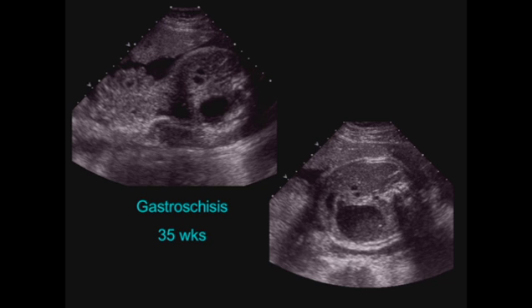Now, of course, this was 9 o'clock on a Friday night, which is, of course, when all of these things tend to happen. And there's a radiology resident on call, and he called me up and said, I don't think I can scan this patient. I've never scanned gastroschisis. I won't know what to do. I won't know what to look for. So I said, that's okay. Give it a try. Go back and look at the priors, and then look at today, and then call me up and tell me what you think.